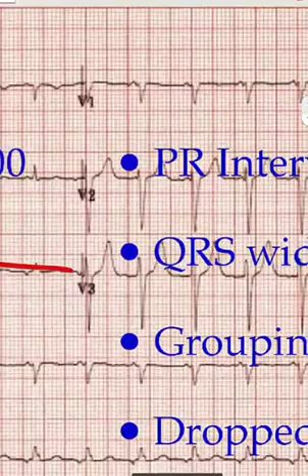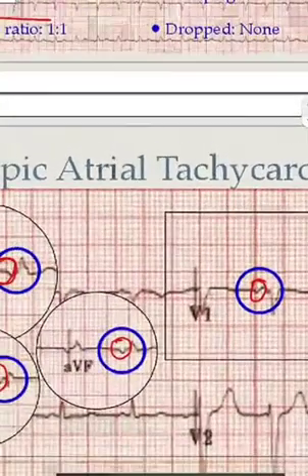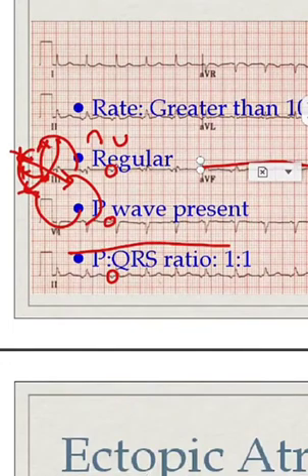Okay. Next one is wandering atrial pacemaker. All these ECGs which I'm going through right now are really tricky. So if you are a beginner, I suggest you don't really go into the details and just try to catch the gist of it. Okay.